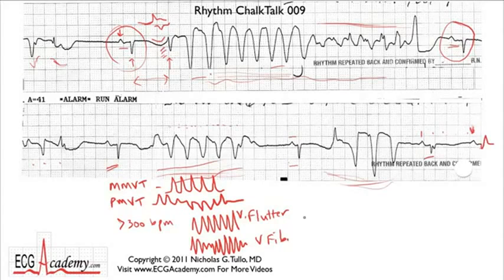You know that. So as far as classification is concerned, you look at this run and you say, that looks monomorphic, kind of sort of, here. It does change a little from one beat to the next, but then clearly it changes in a big way. The beats become much smaller. I don't know what's going on. Help me out, Dr. Nick.